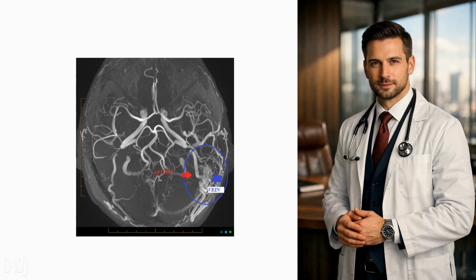The high-flow AVM, arteriovenous fistula. Unlike low-flow cavernomas, AVFs are high-flow emergencies. Abnormal arteries directly feeding veins without a capillary bed. This is the patient who presents young, with an intracranial hemorrhage. The differentiator? Pulsation artifacts on MRI or angiography showing feeding vessels.